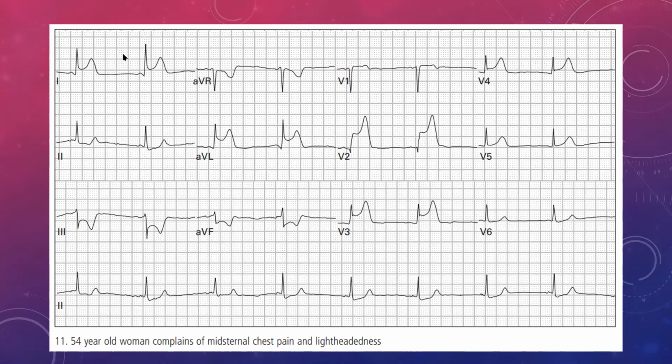It's no problem. So lead 1 is positive, and lead AVF is, I would say, going more to the negative side because the negative is a bit longer. So we're looking at a normal to left-sided axis in this case.